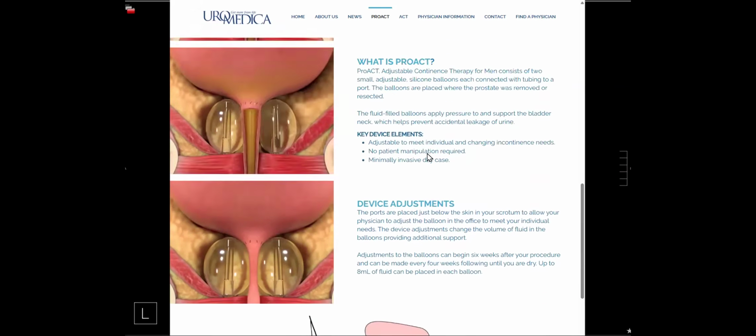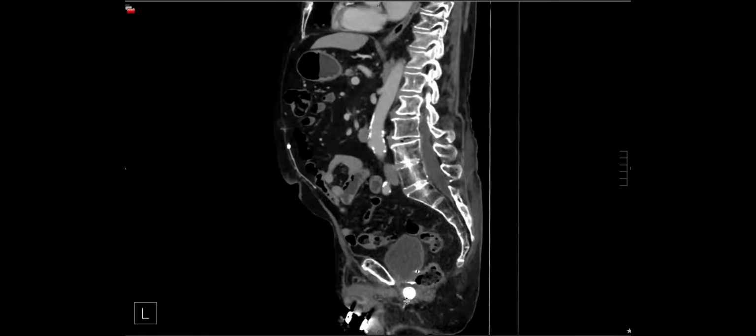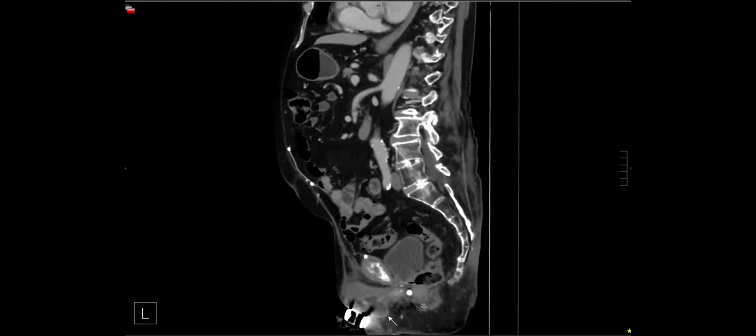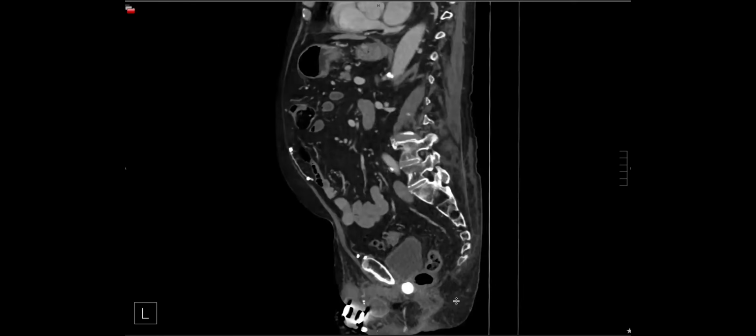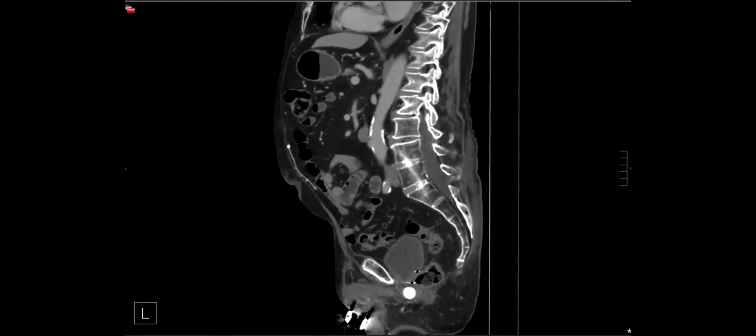That's super cool. It looks exactly like your imaging findings. Yes, Elmo sign. And they must have decided to make it radiodense, maybe to help with CT. Yes, most likely. Similar to how they've made hydrogel hyperdense now. Yep. Awesome.